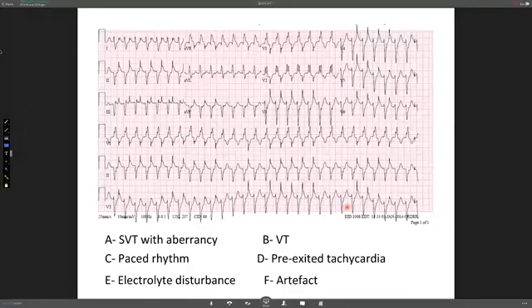Yeah, a very good case, Khalid. Excellent case for a fascicular VT, posterior fascicular VT, based on the morphology. You can see the right bundle, though it has the bunny ear, so it almost looks typical. It has a deep S wave in V6, but it also has the extreme left axis deviation. I think the confusing part is the spikes.